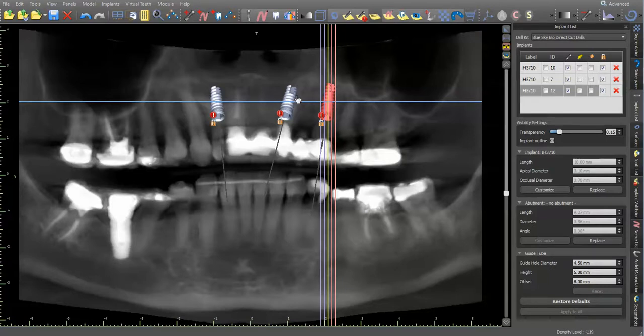Tooth number 11 is actually in tooth number 10 site. I'm going to remove that. And then this tooth's questionable. 11's missing, 12's questionable. So the patient elected just to have it removed.